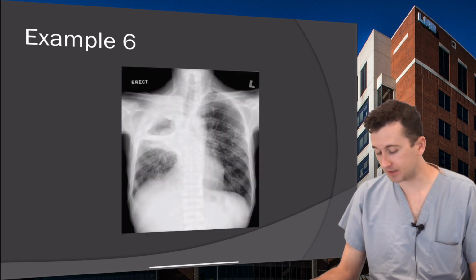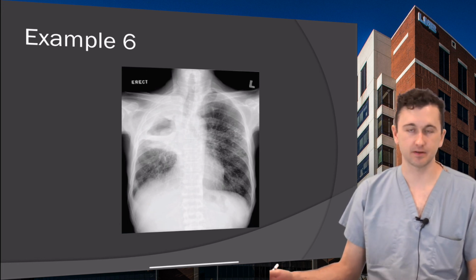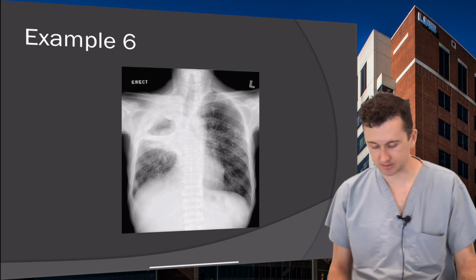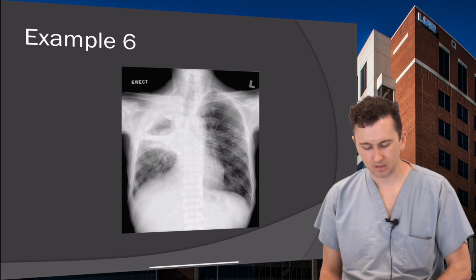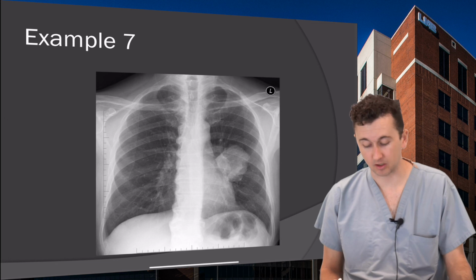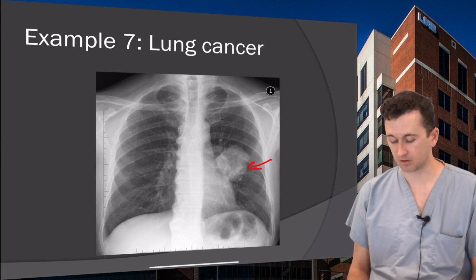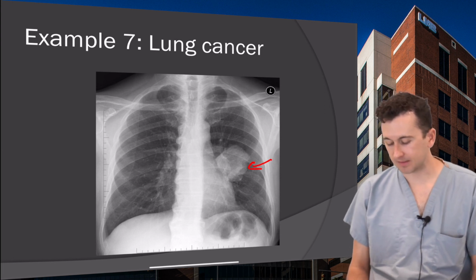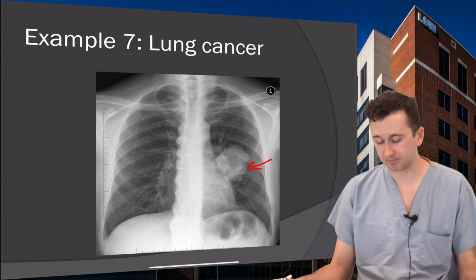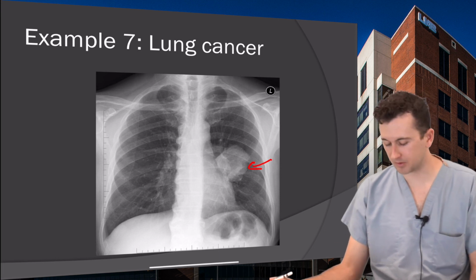Clinical story here is going to be, you know, a 50-year-old homeless gentleman that comes in with hemoptysis, fevers, chills, and productive cough. He's got a big old cavitary lesion, consistent with TB up here. And then lastly, this is a lung cancer. And so unfortunately, most lung cancers are not this obvious. Very, very few are this obvious, but a lot of times these are confused for pneumonia, and clinical history doesn't always differentiate these two, because a lot of lung cancer patients actually present with a pneumonia, so it gets challenging.